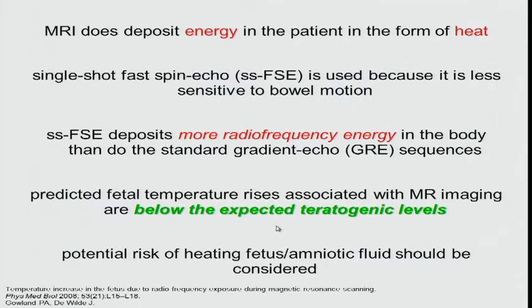So we've got a GE scanner here, is that correct? That's correct? So you're going to look at the GE acronyms. And so with these gradient echo sequences, they optimize the physics of what they're doing to show you different things. So it sounds very confusing, but you can sort your way through this. So we're just going to talk a little bit about some MR sequences just for you to get your feet wet and start figuring out how to approach looking at a multi-sequence MR exam.